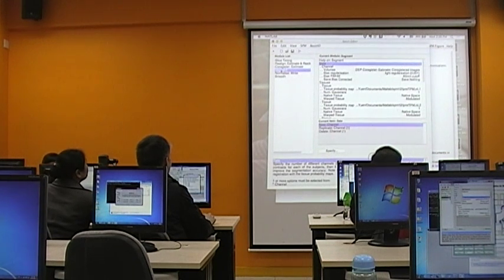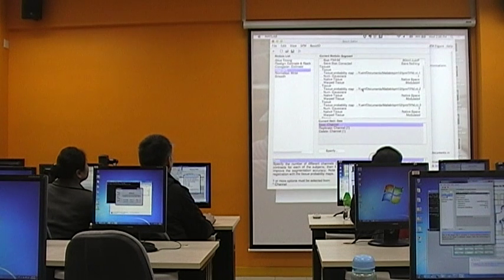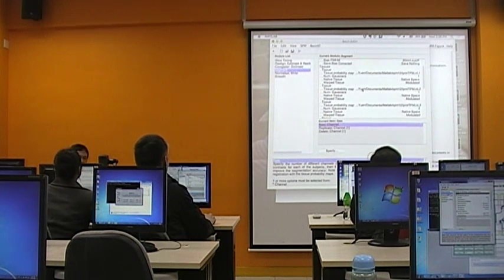One more thing. If you are going to do VBM analysis, you might want to ask, okay, you mentioned that you would need to use the normalized modulated image as the input for a voxel-based morphometry. So how you could obtain this kind of images is here.